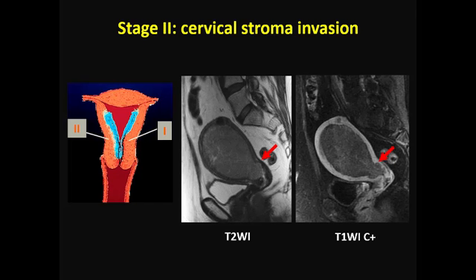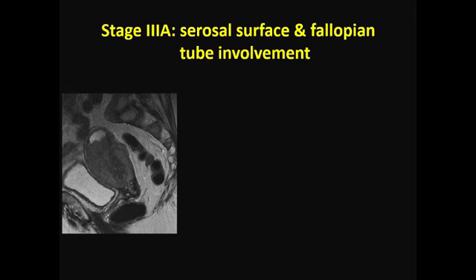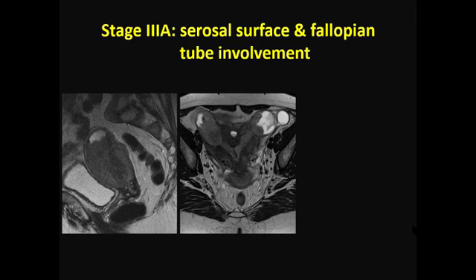Very, very important, because those patients have vaginal brachytherapy after their surgery. So you can counsel a patient before they actually start their treatment. Just to give you many phases of stage 3A, at this point you probably don't need anything beyond the T2 anatomical images. This large tumor, obviously, the serosa is gone here. You can see the tumor is outside the uterine contour.